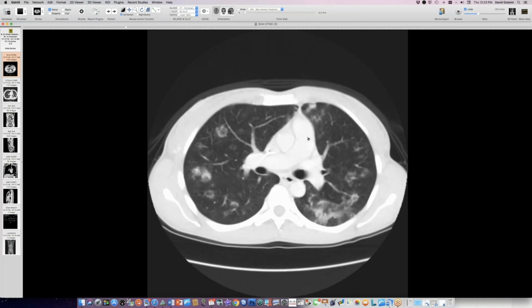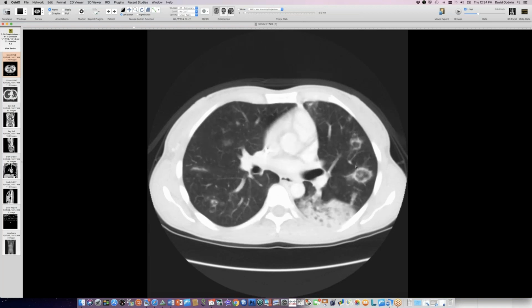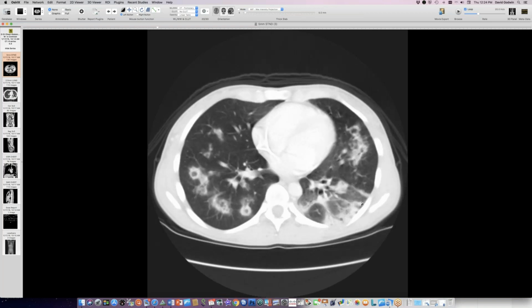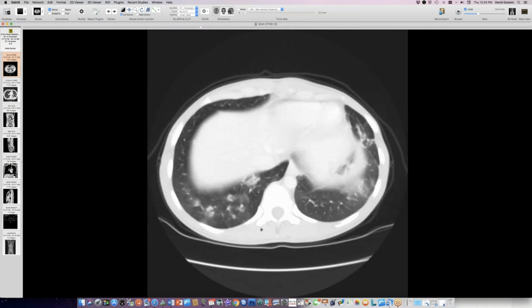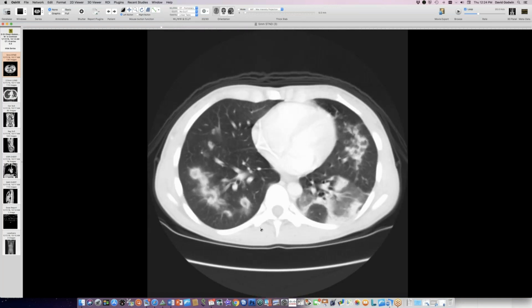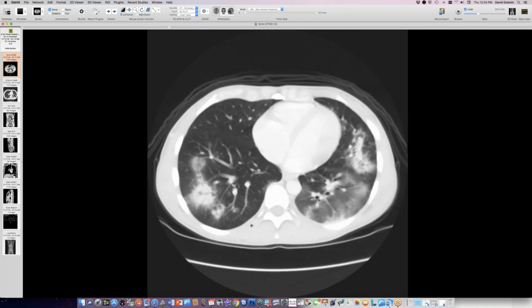She'd been on that for 3 months or something like that, and then developed this pattern of a little bit of shortness of breath and very nice organizing pneumonia pattern in the bases with very nice atolls or reverse halos here. So it's definitely organizing pneumonia radiographically, and they had a hard time pinning this on the therapy because she'd been on the therapy for several months at the point that this developed. But I don't think these things always follow our rule.